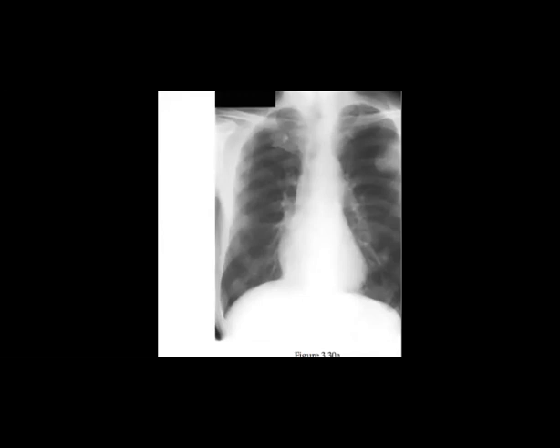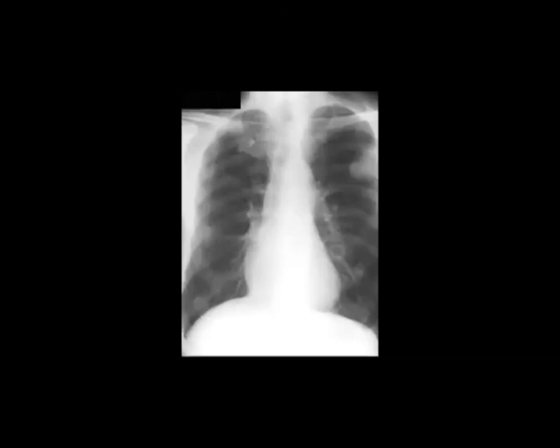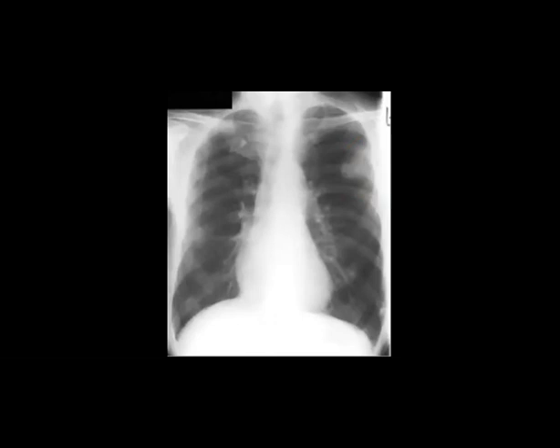I'll just try to make it clear for you. So I see, yeah, someone try to answer. Frontal radiograph, like he is old, maybe male, no breast shadow.